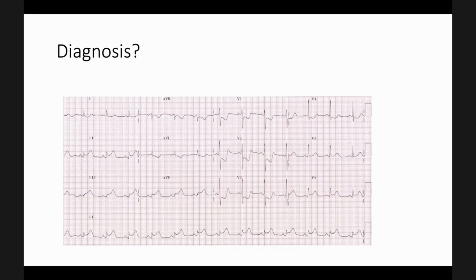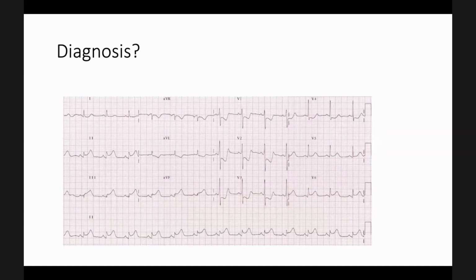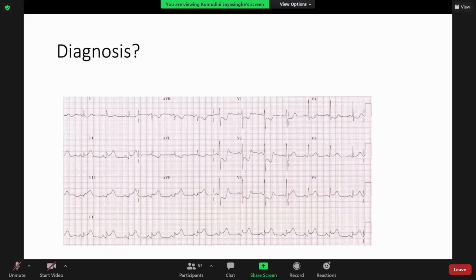What can you see here? Anyone can guess, it's not difficult.